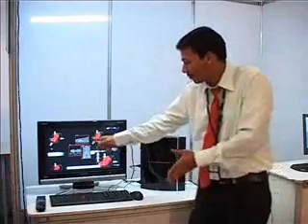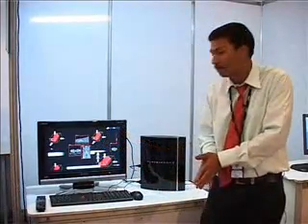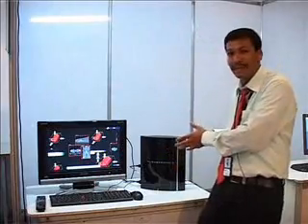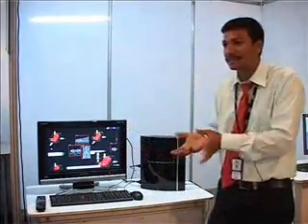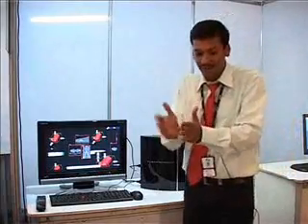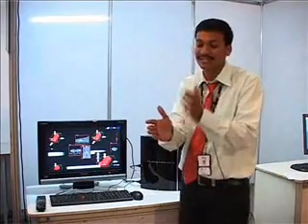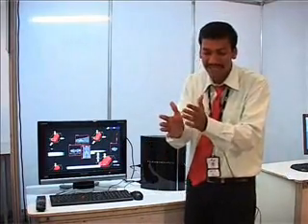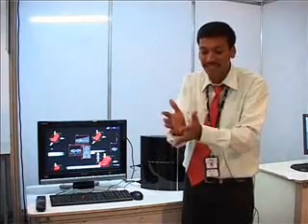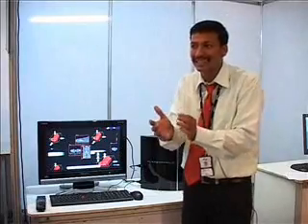Here are 3 screenshots taken from our MPR application, which is developed on our IBM-CELL. And why we went for IBM-CELL: suppose we have 2 slices. If the user wants a slice between these 2 slices, then using the information of these 2 slices, we produce a virtual slice by doing interpolation.